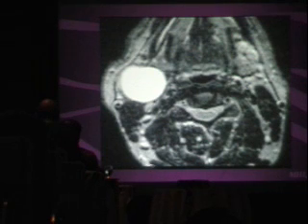First or second? Second branchial cleft cyst, very classic appearance, but there is a limited differential, especially if it becomes infected. So where is a second branchial cleft cyst? It's a simple, again, unilocular cyst, posterolateral to the submandibular glands, anteromedial to the, what muscle is this? Sternocleidomastoid. Simple unilocular cyst.